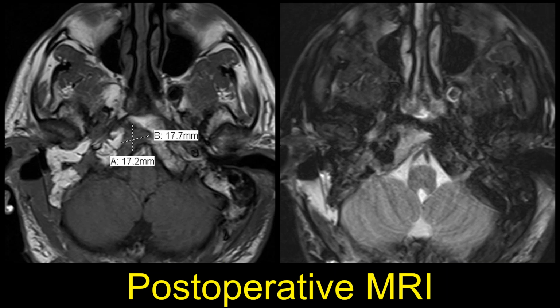And this was a combined approach. It was actually a middle cranial fossa approach and a translabyrinthine or pre-labyrinthine approach to get to the petrous apex. So the neurosurgeons and the neurotologists were both arguing for several days because they both thought that the other one had left tumor, because we had mistakenly called residual tumor on this case because this was bright on the T2.